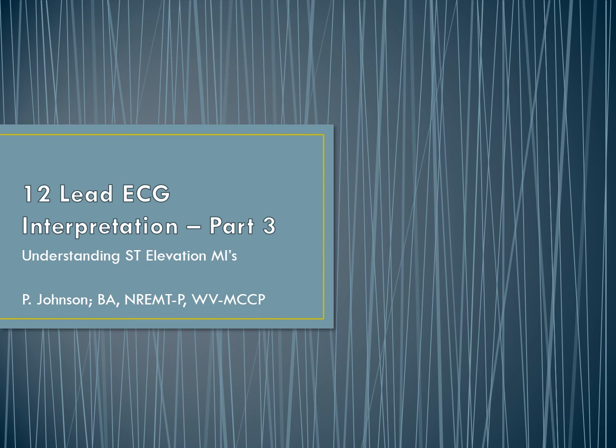This lecture is going to review your understanding of the ST segment and how it relates to the coronary vessels and when it is appropriate to call a STEMI in the field.